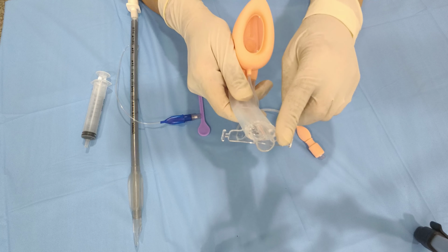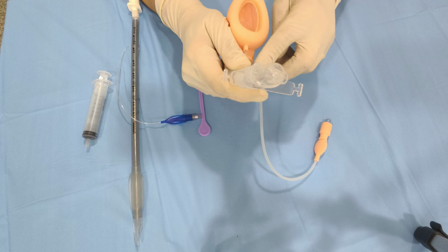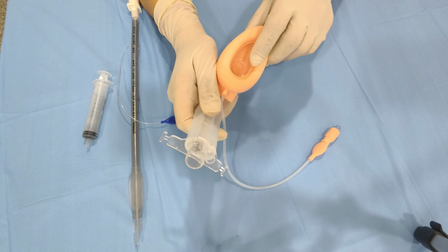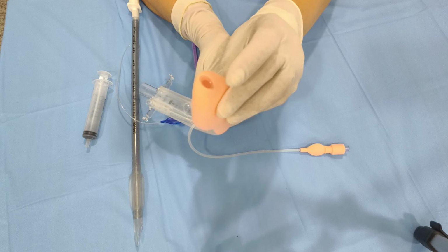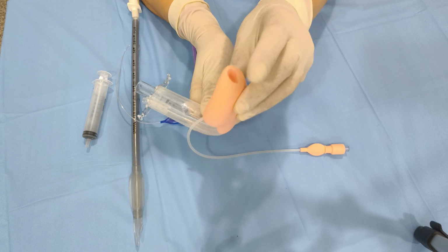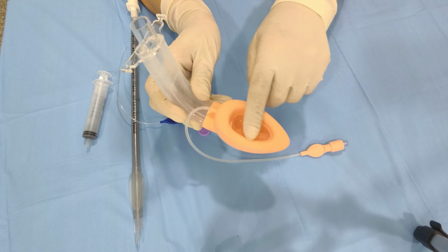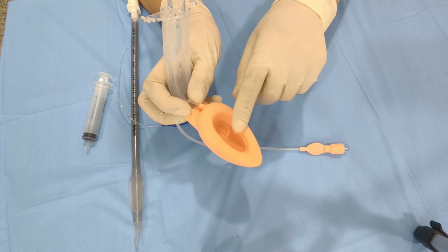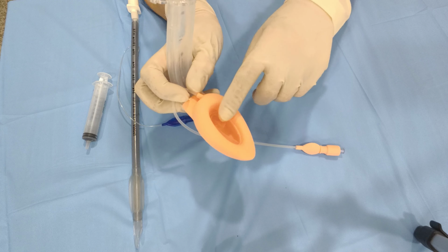This is the gastric channel tube or the gastric drainage channel. It allows passage of a gastric tube for decompression and reduces aspiration risk. This is the opening of the gastric channel tube. There is a 30-degree wedge, which is a rising wedge, and the internal ramp which targets the endotracheal tube directly into the BlockBuster.